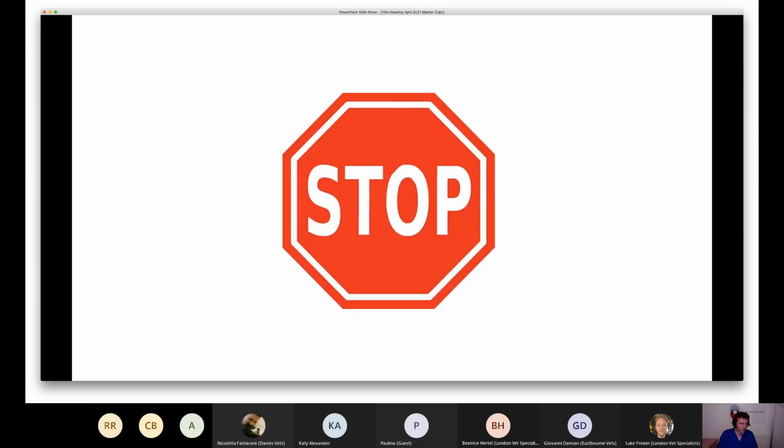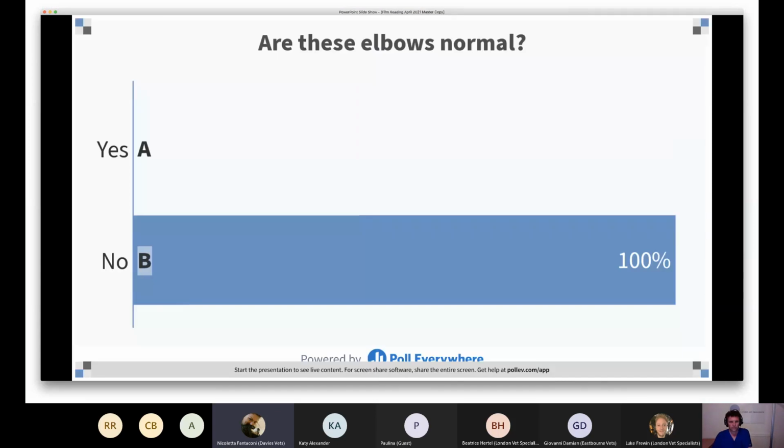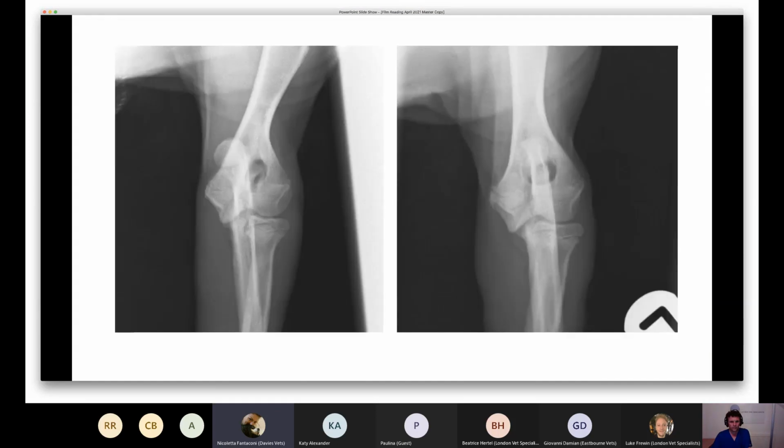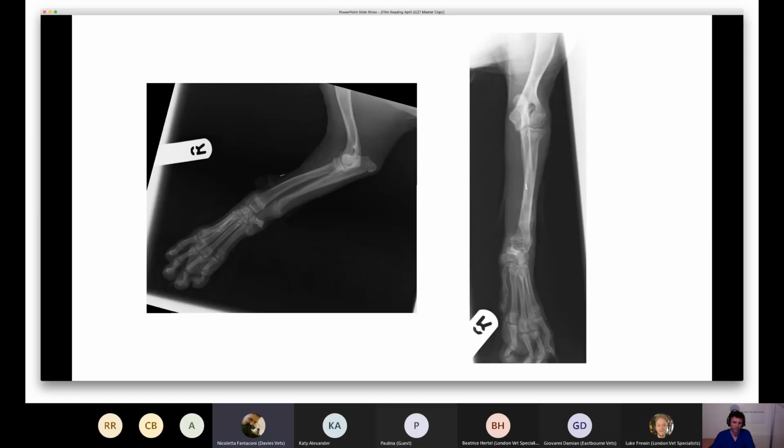All right, any questions about this one before we move on to case number 4? Can I ask a quick question? Yeah. On the right elbow, on the mediolateral view, I thought as well, but because you have a superimposition, it's quite difficult to say, at the level of the dorsocranial aspect of the anconeal process, so there was probably a fissure line, but because there is all this superimposition, I wasn't sure, and then with the CT, it's not.